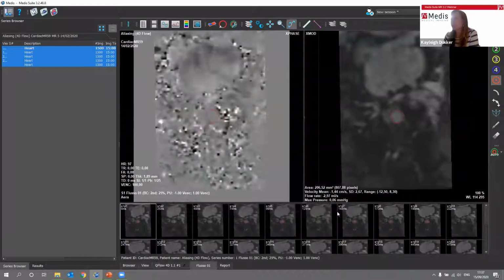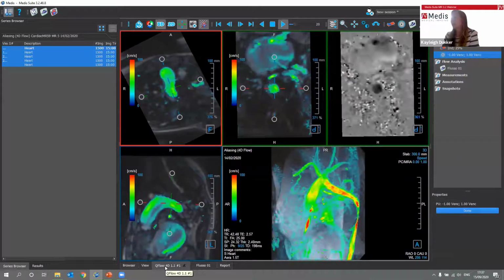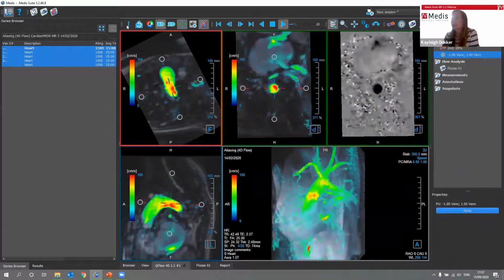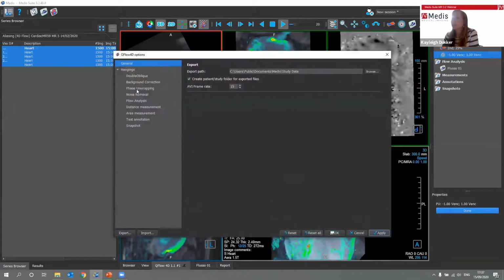So to make this measurement more reliable. If it hadn't worked completely, if there would still be some white pixels in here, in the settings there are still options to change that.